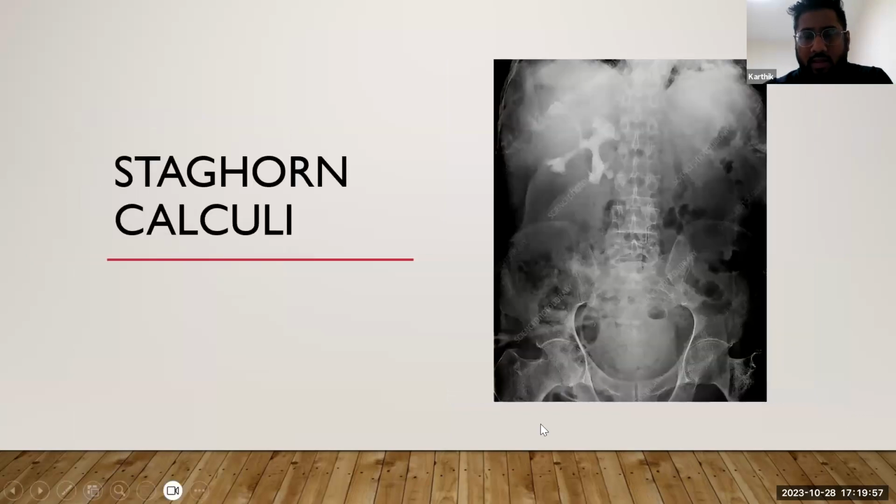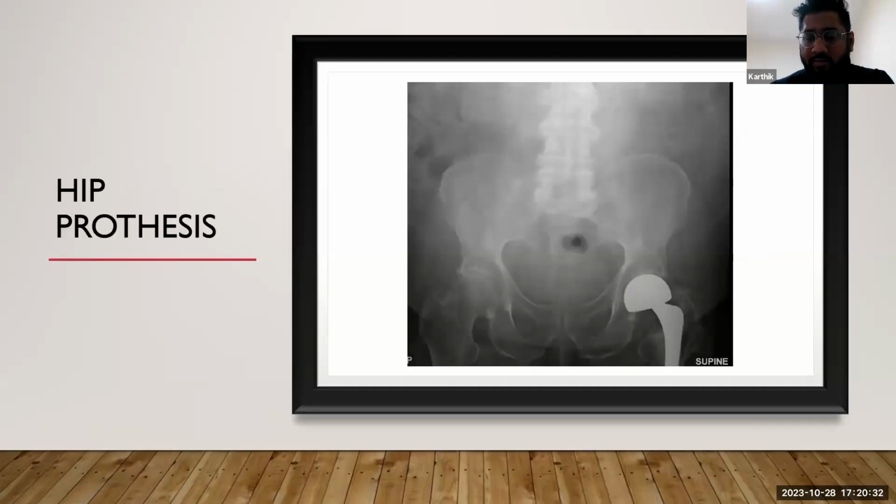Perfect. So other things that can be identified on an X-ray are kidney stones. Like we said earlier, bone or calcifications, which is essentially what stones are, appear very white and dense due to their density. Here you can see staghorn calculi. You can also see kidney stones and gallstones on X-rays as well. But to identify staghorn calculi, renal stones, or gallstones, really you would need CTs. With renal stones, you'd use CT KUB. Abdominal X-rays are really not the way to diagnose them.